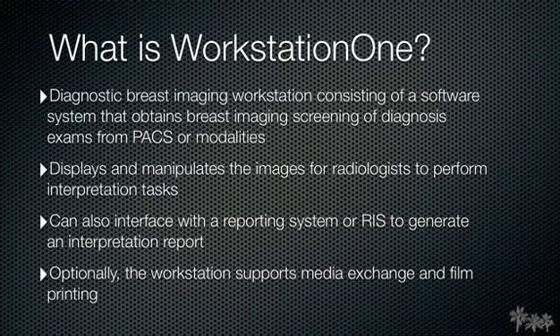First, breast imaging screening or diagnosis exams are obtained from the PACS or modalities. Then the workstation displays and manipulates these images for radiologists' interpretation. Finally, the workstation can interface with a reporting system to generate an interpretation or screening report.